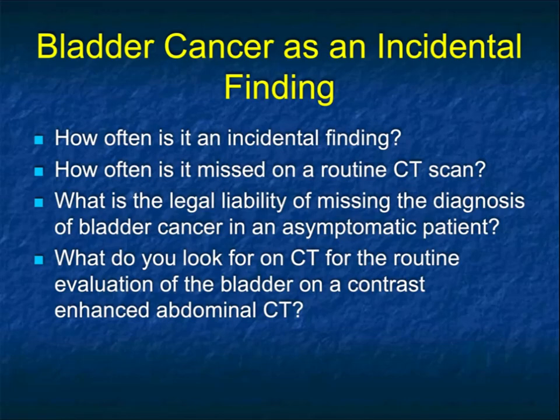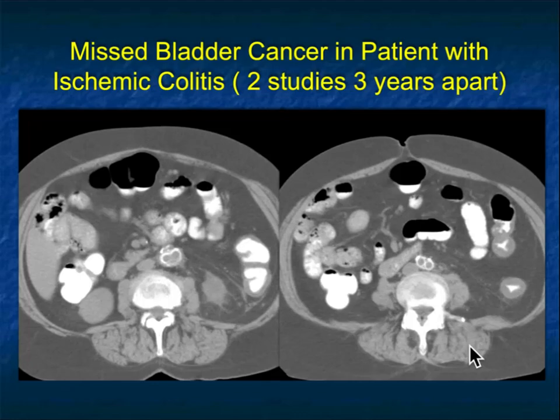I'm asking you, how often is bladder cancer an incidental finding? And how often is it missed on a routine CT scan? What's your liability? And what do you look for on CT for the routine evaluation of the bladder on a contrast scan? Now, the reason this came up was twofold. The first is this case. This is a non-contrast CT scan, and I looked at this for the MedChi of Maryland. It was a legal case.